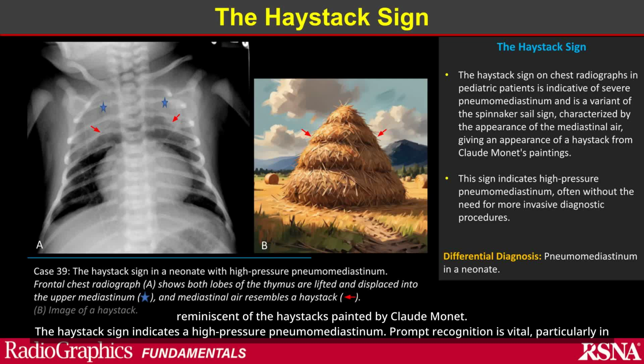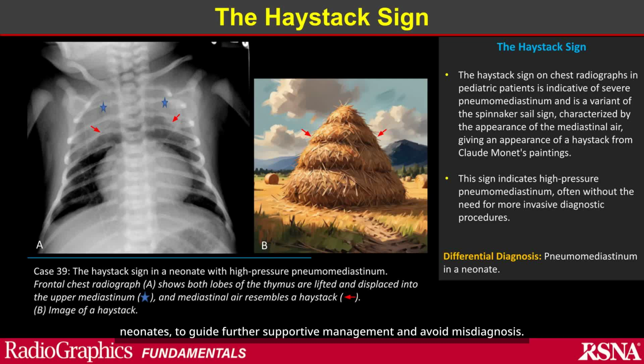The haystack sign indicates a high-pressure pneumomediastinum. Prompt recognition is vital, particularly in neonates, to guide further supportive management and avoid misdiagnosis.